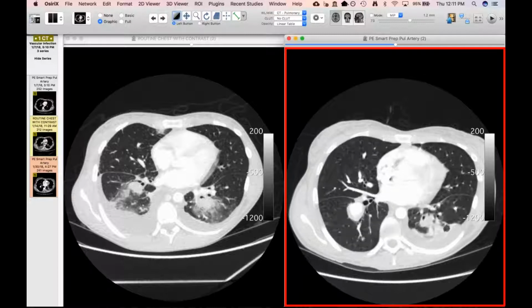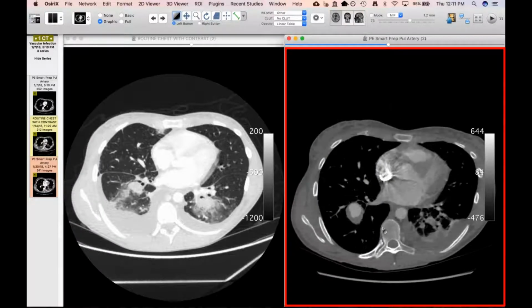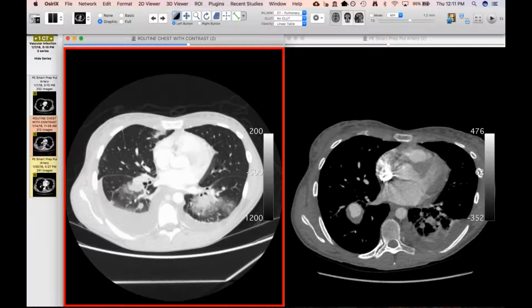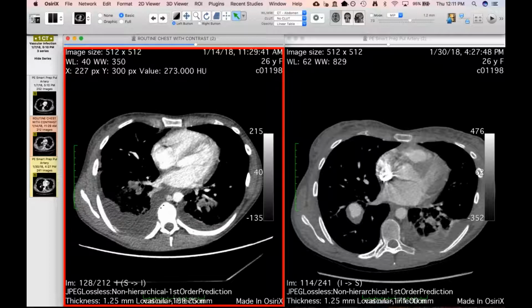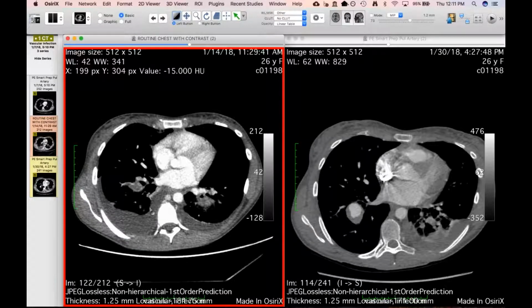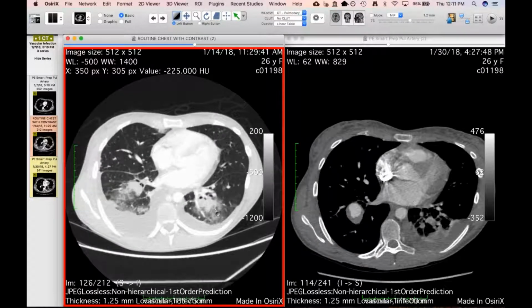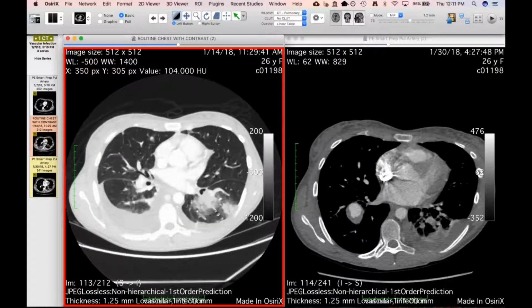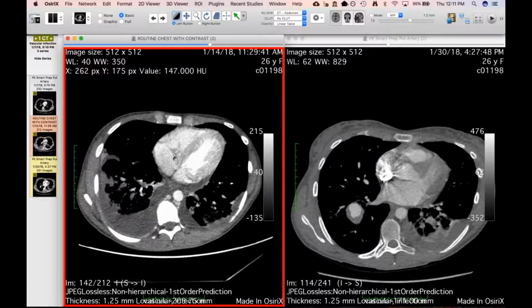It's interesting to answer the question, how much of the stuff in the pulmonary vessels on the previous study was clot, infected clot, and even just inflammation. It's almost like they're surrounded by ground glass opacity in the lung even. Yeah, right. That's a good point, like in here. Yeah, very dramatic. And she still had a little vegetation on her tricuspid valve too.